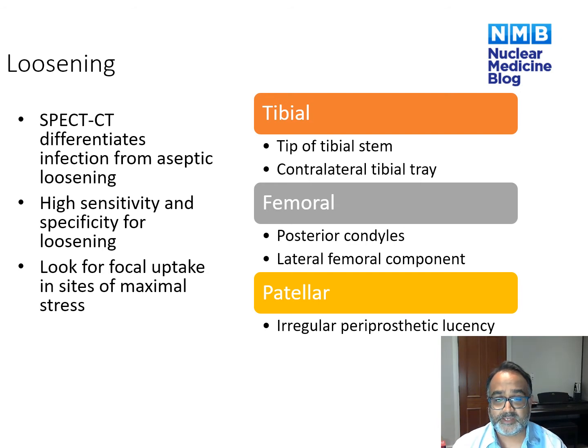Finally, don't forget that there is a patellar component which can also be loose. And if you see increased uptake associated with an irregular periprosthetic lucency around the patellar component, this also suggests loosening of this component.